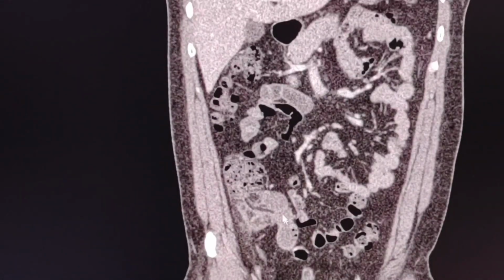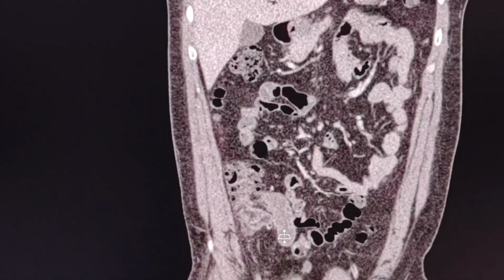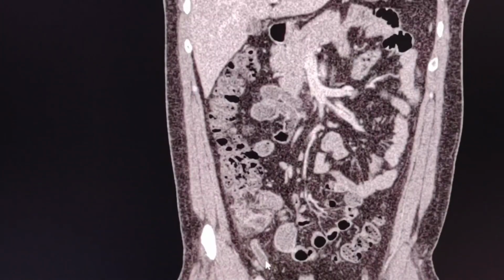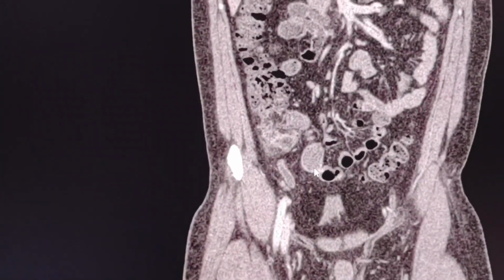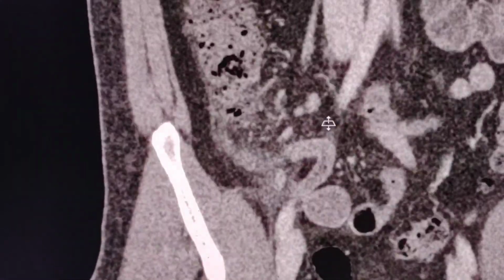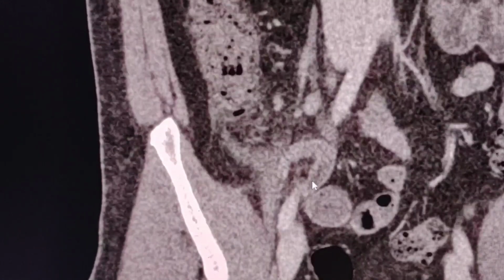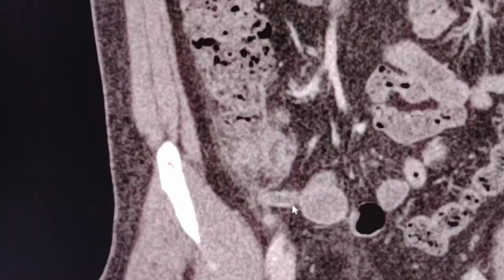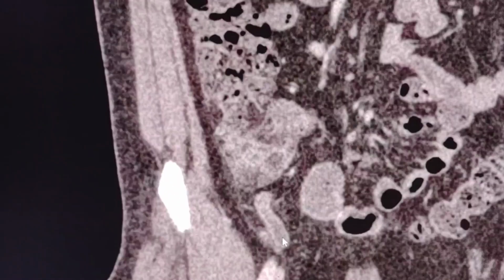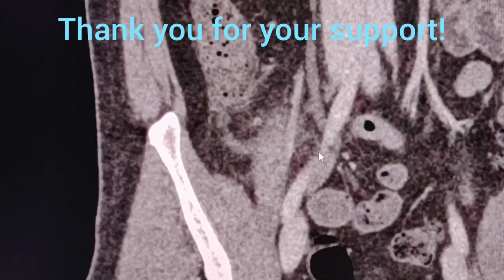Here is the terminal ileum in coronal view. We can see it better. And here is the appendix. It is quite elongated, it is a long appendix, as you can see. There are some inflammatory changes, and I believe that these are secondary, as I described previously.